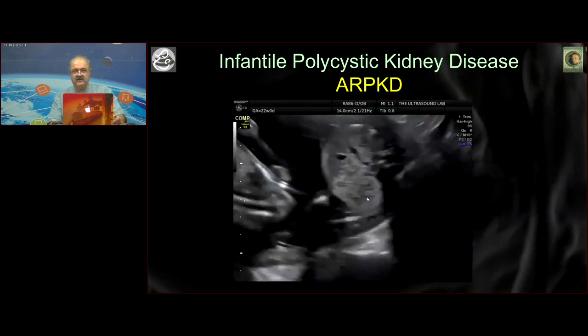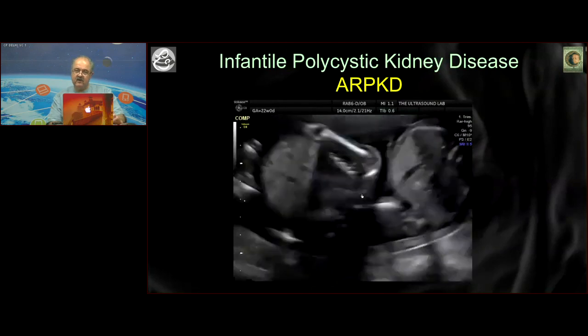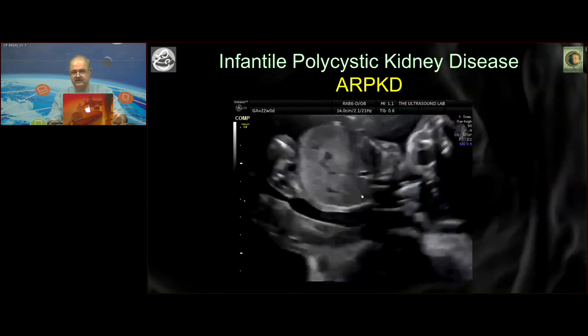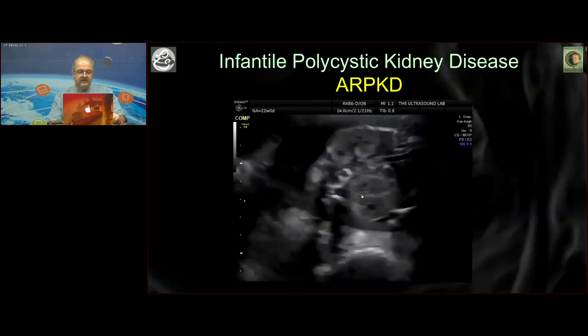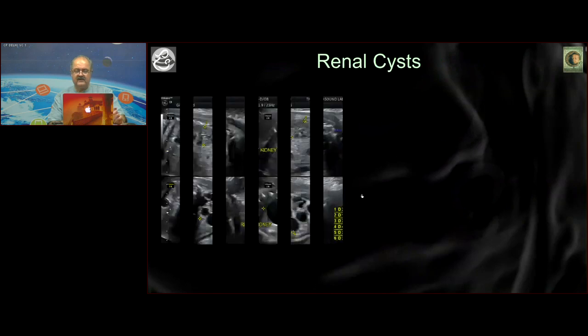We know very well that it is a cystic kidney and yet echogenic, because the cysts are too small and all we are seeing, the walls are butting each other, and therefore they don't appear as true cysts. You also need to differentiate other types of cysts, and that is the next category.